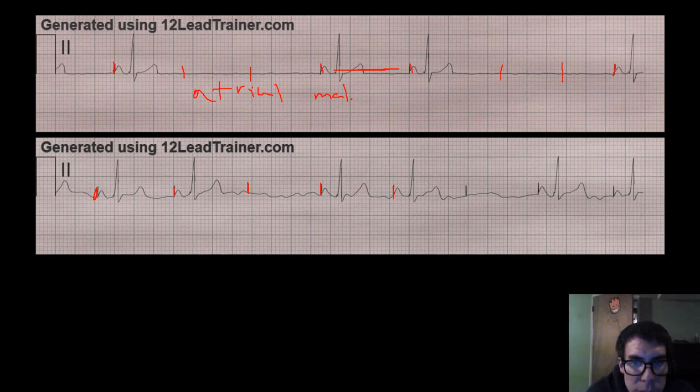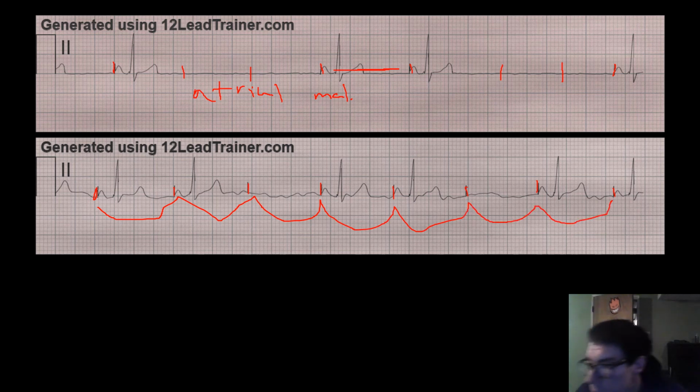Those abnormal looking perfectly vertical lines. So some of them aren't generating impulses, however, they do have a regular interval. So that would be a failure to capture, which I actually think the top one is too, now that I look at it.